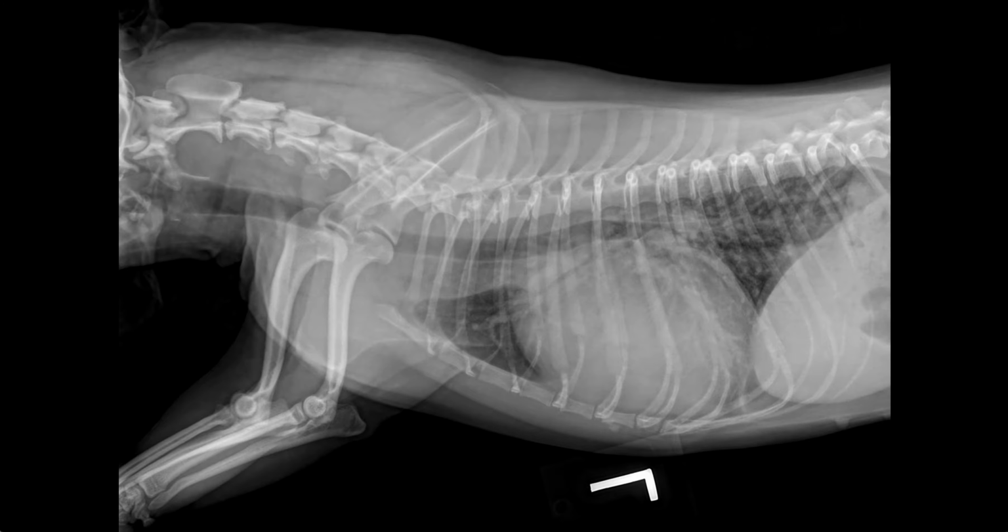This month's theme is pulmonary patterns. It's time to take a breath. We are going to take a journey, albeit abbreviated, through the four broad classifications of pulmonary patterns. While collectively we recognize that there are the vascular, bronchial, interstitial, and alveolar patterns, there are subcategories within each that may influence the order of radiographic differential diagnoses. It is always important to keep these findings in the context of the patient history and exam. A short commentary will be included after each case about the pattern.